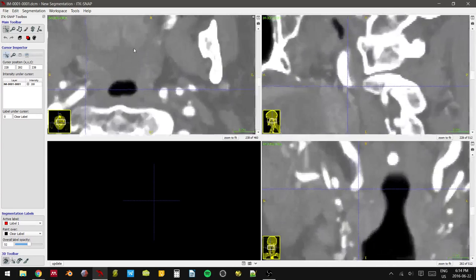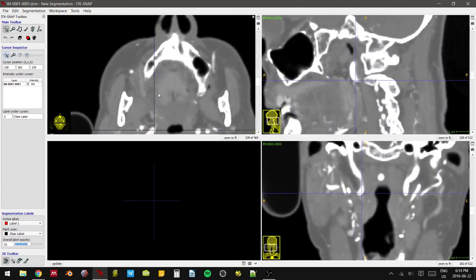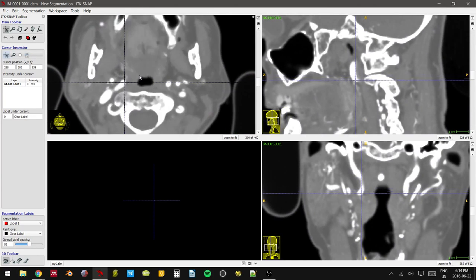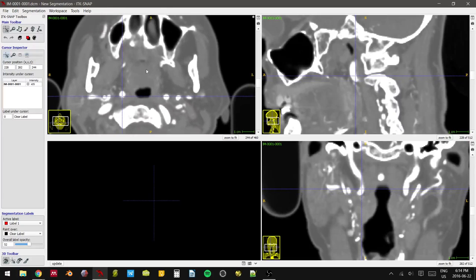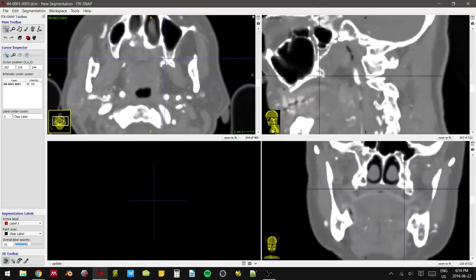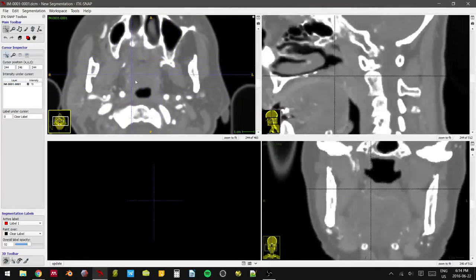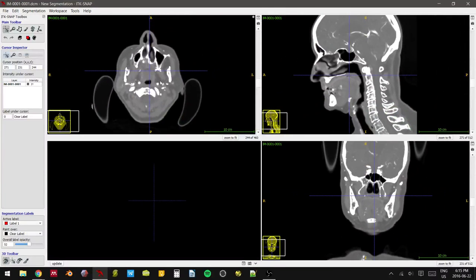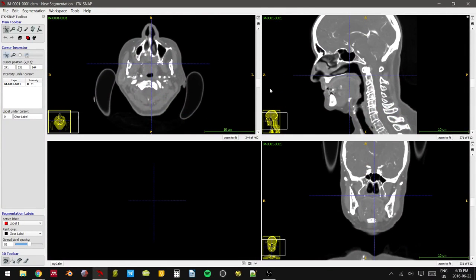And right click is to do that zoom in. So again, middle mouse click to pan around and drag your image. Mouse wheel up and down to scroll through one image slice. And then left click to simultaneously shift all other views that you're not currently on. Pretty cool.